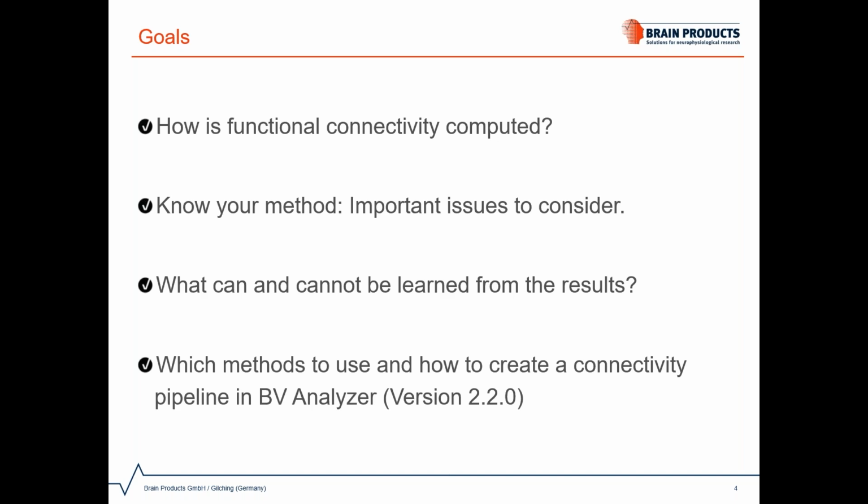In the hands-on session, we will create a connectivity workflow and apply it to real data. Along with this pipeline, we will learn how to use some of the modules in Analyzer that provides this methodology. Note here that parts of the modules that we will use are only available starting from Analyzer version 2.2.0.